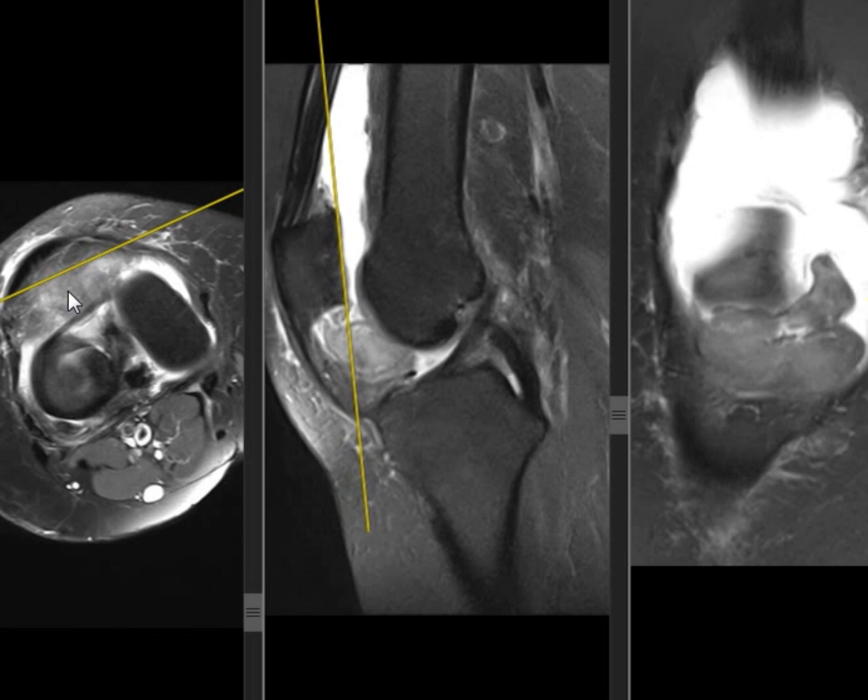This is a soft tissue. This is not a cyst, it is not fluid signal intensity. Second. Third. Synovial sarcoma. Good. Synovial sarcoma appears as an aggressive lesion. Is this an aggressive lesion? It looks benign: clear, surrounding bone has no bone marrow edema, no obstruction, no invasion, clear surrounding soft tissues.